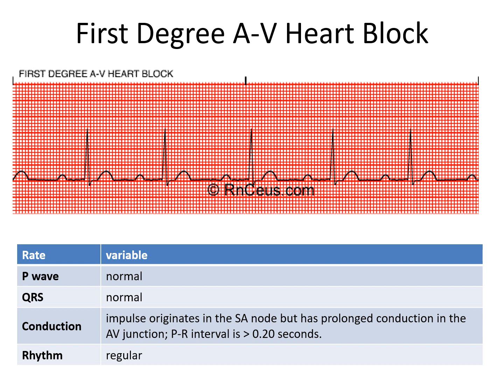We have the P, QRS, T, P, QRS, T. So it looks really quite normal, and there appears to be a P wave before every QRS. So it looks like maybe this is a normal sinus rhythm or possibly a sinus bradycardia. But that is not what it is at all, because if we go on and measure the intervals, we will discover something else about this particular EKG tracing.